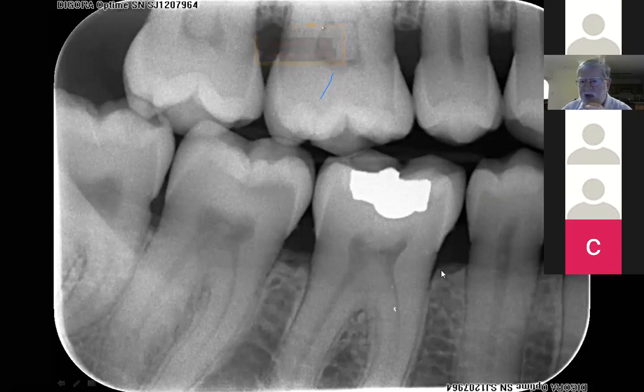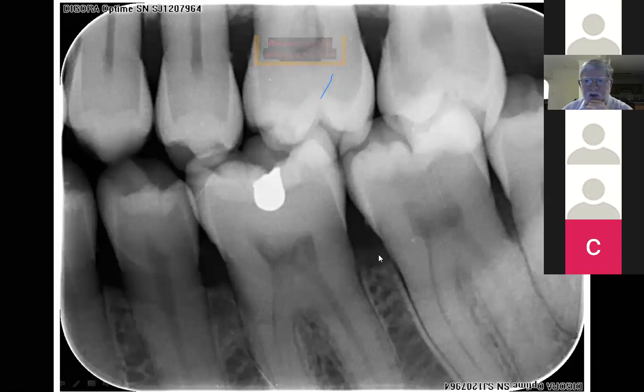When you lose that, you know bone is starting to dissolve away, in response to irritation from bacteria. The deposits harden, so you can see there's a bit of subgingival calculus there. And when you're not cleaning well enough, especially as you get older, your body's not going to fight back so well, and you're starting to lose some bone. And you can help them to bring things under control.